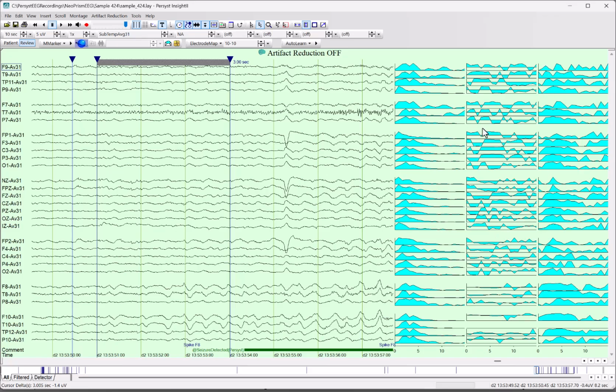But the other thing to keep in mind is the phase relationship. As this goes below the line, those minus ones, it's leading, and above, it's lagging. So that's the phase relationship. This is at the bottom of this curve. It's minus 180, plus 180. So that's the phase angle.